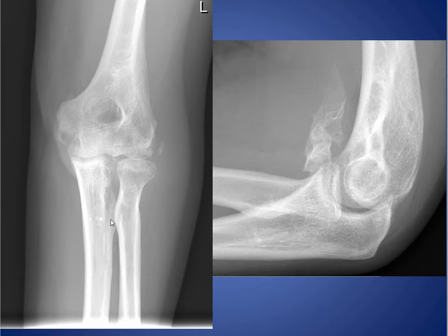This is an example of sequelae that occur after previous dislocations. We typically see these areas of heterotopic ossification in the expected regions of the collateral ligaments because those collateral ligaments were torn at the time of dislocation. You can see in this lateral projection that heterotopic ossification has formed around the anterior capsule and the brachialis muscle. Those structures are usually injured in posterior dislocations. There's probably a small coronoid fracture fragment here.